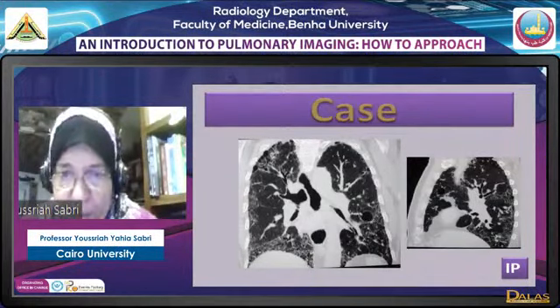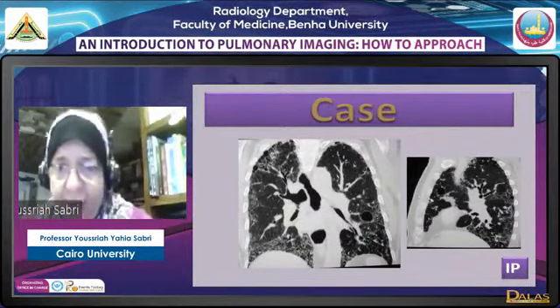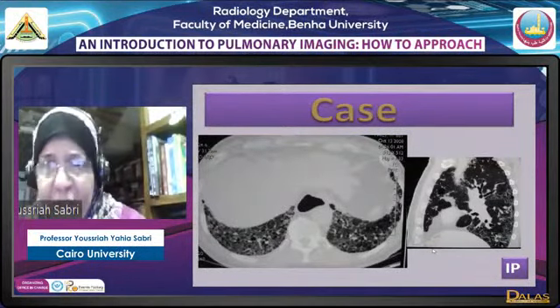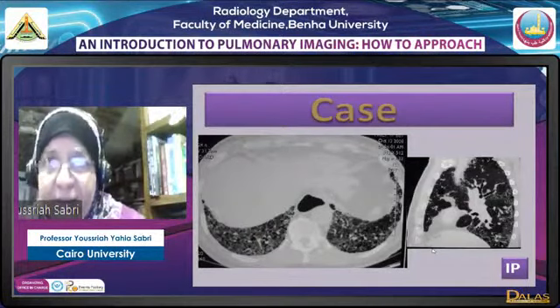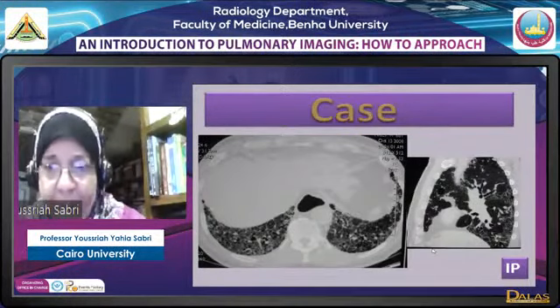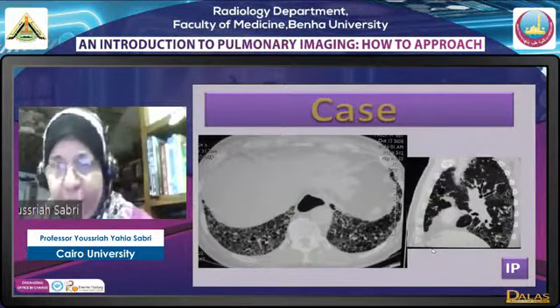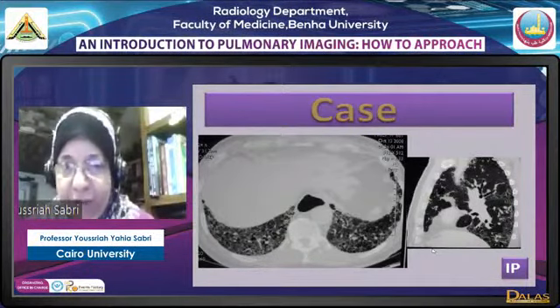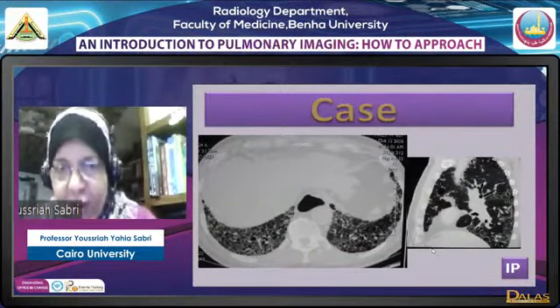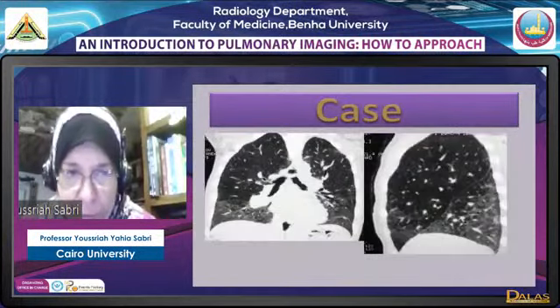In this case also, as you can see here, there is a cyst seen on the left side in the coronal image and anteriorly in the sagittal image. These cysts, in addition to the interstitial pattern of this disease, will suggest that interstitial fibrosis here is a type we call lymphocytic interstitial pneumonia. Why? This is a pattern of interstitial fibrosis, bilateral fairly symmetrical subpleural, ground glass opacification, reticulation, prominent intralobular interstitium. In addition, the patient is known to be a case of collagen disease, which is scleroderma. This case is then lymphocytic interstitial pneumonia.